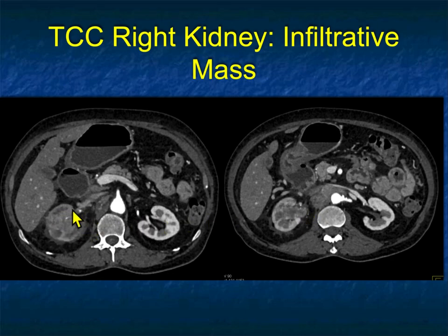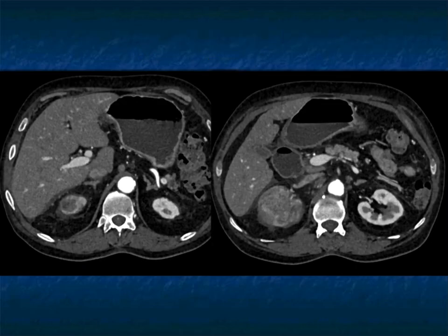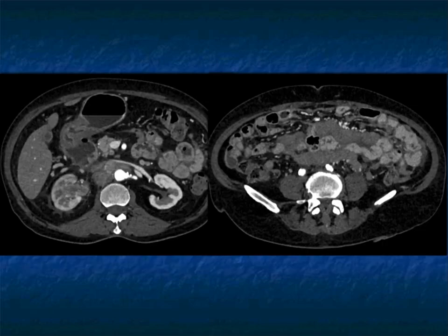But my first look is, I'm thinking there's a renal cell. I'm not thinking transitional cell. There's some vascularity in the mass, and TCCs are typically considered hypovascular, but they can have increased vascularity, as you see here. And then we'll keep going.